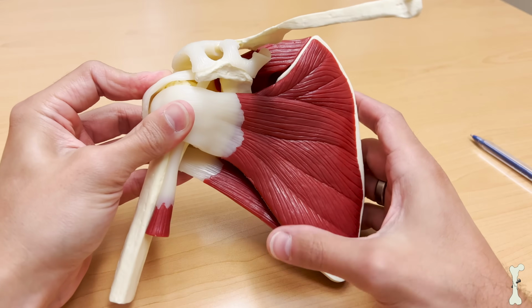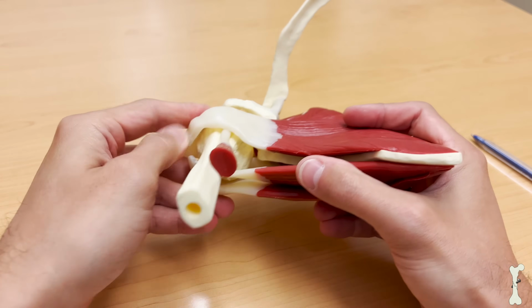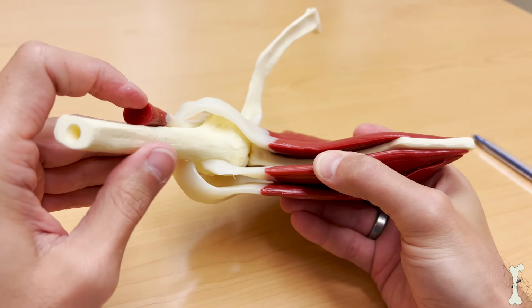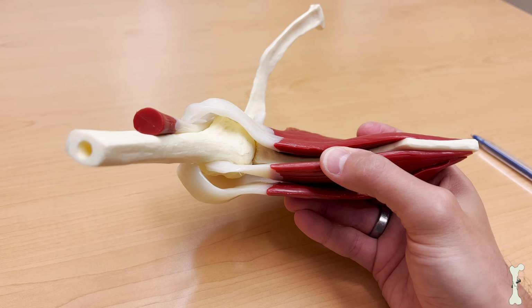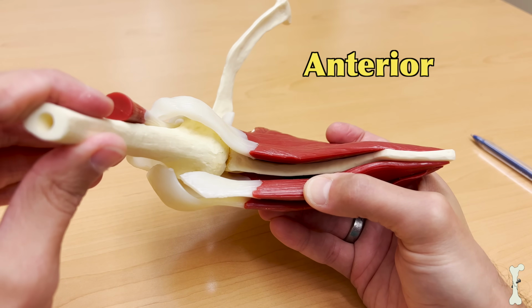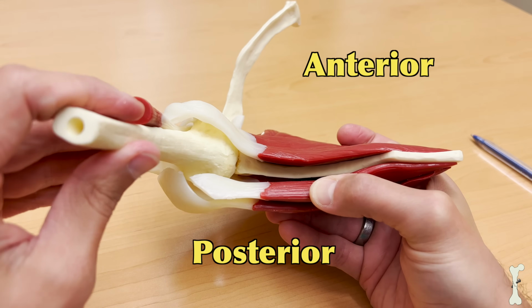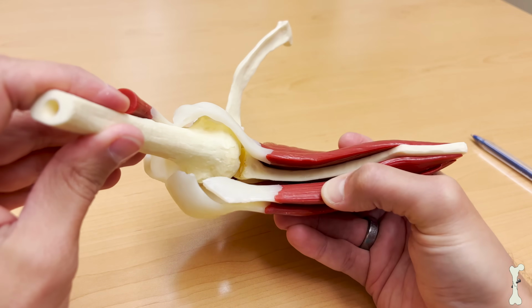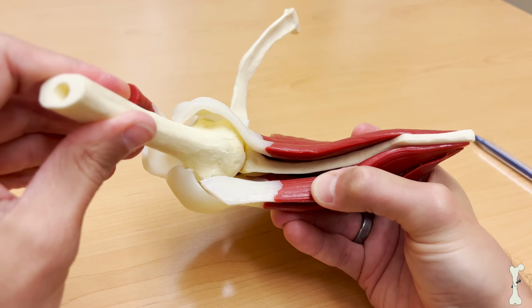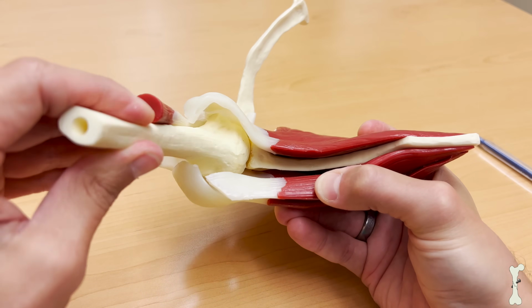In this video, we're going to look at the axial view on the MRI, or the axial sequence. And as I rotate this around, you can see how the perspective changes on the model. And so this part in the front is the anterior aspect of the shoulder blade, and this in the back is the posterior aspect of the shoulder blade. We can see the humeral head right here, and as I retract the muscle out the way, and if I rotate the humeral head, we can see how it articulates and rotates within the socket, or the glenoid.